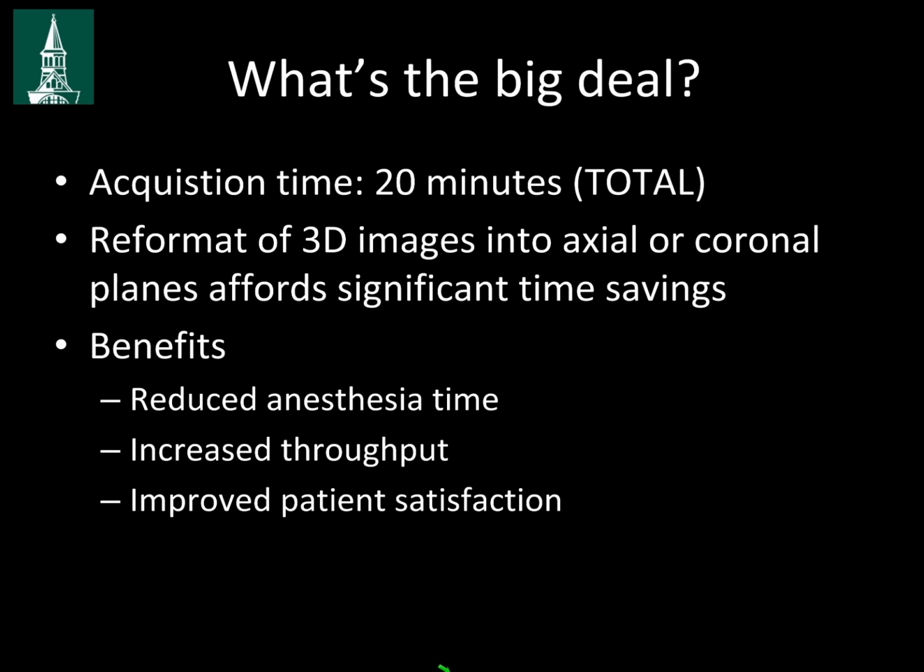So what's the big deal? That patient was done in 20 minutes. You're talking about just sagittal acquisitions and then axial reformats. You can get them in any plane you want. You can oblique them. You can get them parallel to the disc if you want.